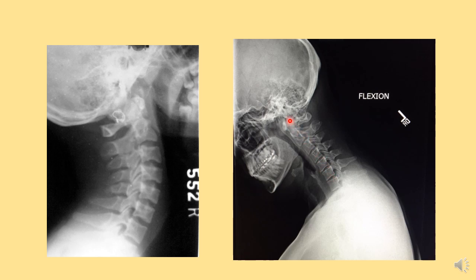And here you can clearly appreciate the external acoustic meatus of either side, 1 and 2. And you can also appreciate air cells in the mastoid bone here. And here as well, there are some pockets, cotton-like appearance. They are mastoid air cells. Here, the hyoid bone can also be appreciated. You can see a black shadow here running down from here. This is the pharynx and this is the larynx. Air is present in the larynx, so it shows a black shadow.